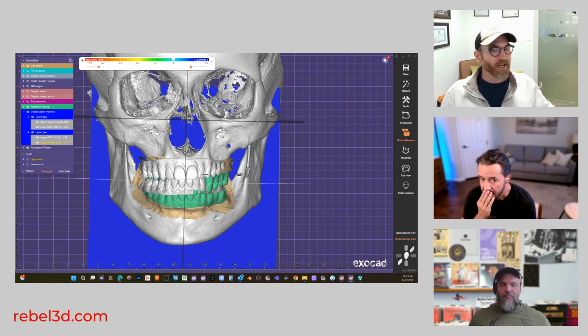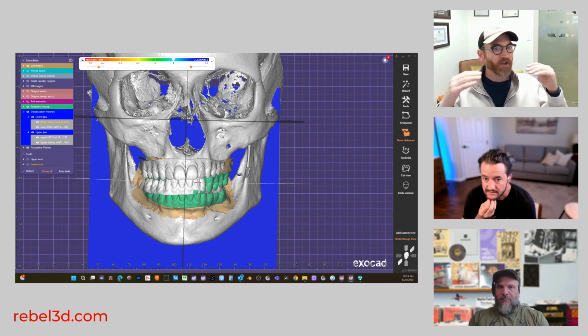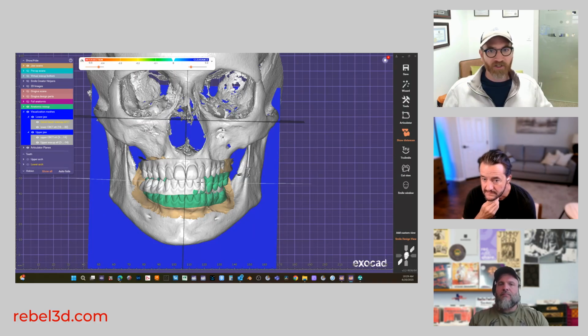So when you're doing smile design and facially generated treatment planning, it's all based on how you mount the upper to a photo. It's all about the maxilla and the photo lining up. The lower jaw is just going to be moving around. You just have to figure out how to interdigitate those accurately. But aesthetics all comes from mounting the teeth to the maxilla, and then mounting those properly so you can look at the face correctly.